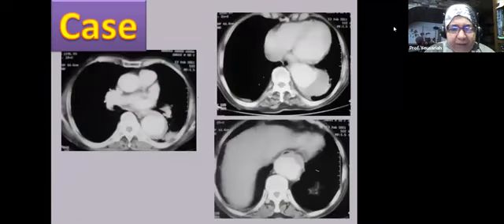Now we have a descending aortic aneurysm, as you can see. What simulates wall thickening on the first image is thrombosis. It's a large thrombus. And now we have another finding: what looks like leakage here, with minimal effusion.